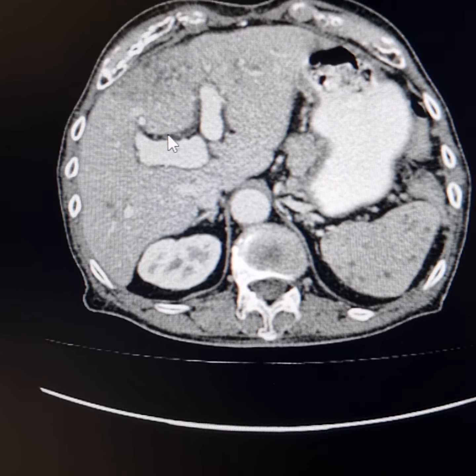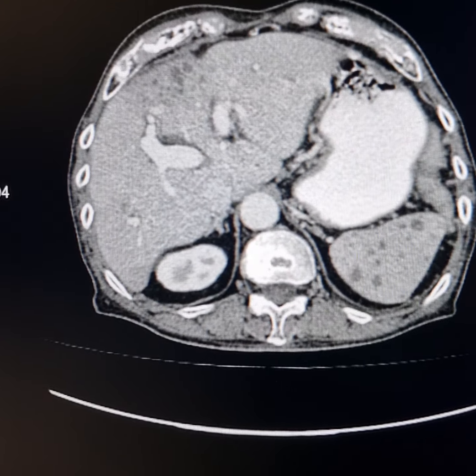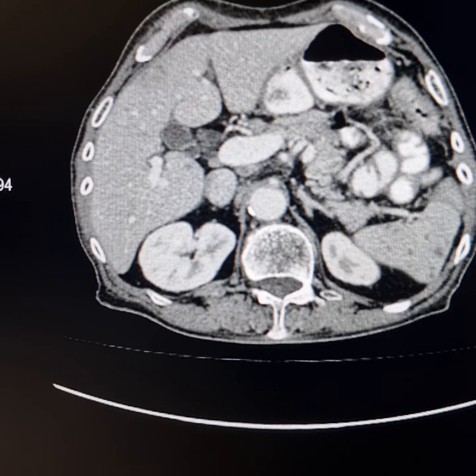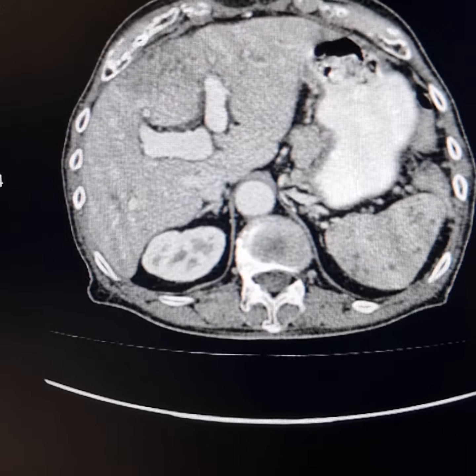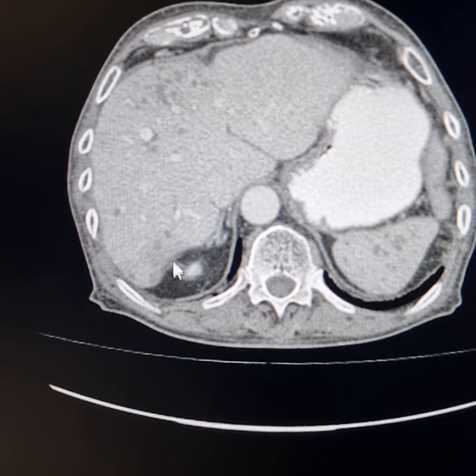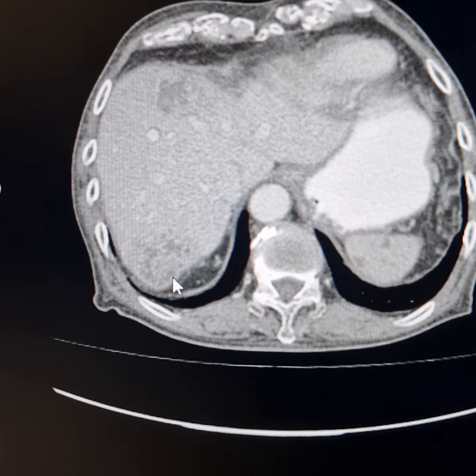If liver abscesses were not there and similar hypodense lesions were present in a case of tuberculosis, the possibility of granulomatous inflammation or infection of the spleen should have been considered. But now, since the liver is involved, there are evolving liver abscesses, and you can just make out that alongside these abscesses, the density of the adjacent fat is increased. This is suggestive of the inflammatory process here.